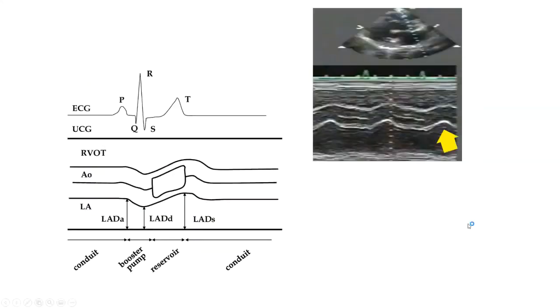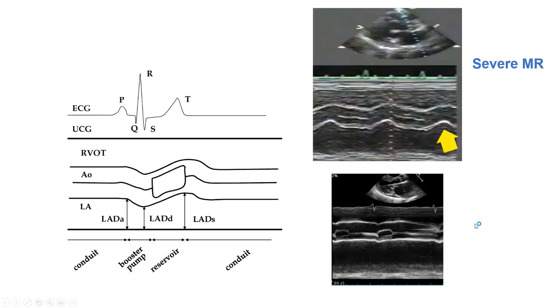Now, just a couple of points to make some of the indirect evidence that one can get from the motion of the posterior wall of the aorta. Remember, the aorta shares the wall with the left atrium. And what one sees here in severe mitral regurgitation during systole, the left atrium is exploding and getting much larger very quickly. And that is due to the torrential mitral regurgitation, which is expanding the atrium in systole. We're showing this diagrammatically here.